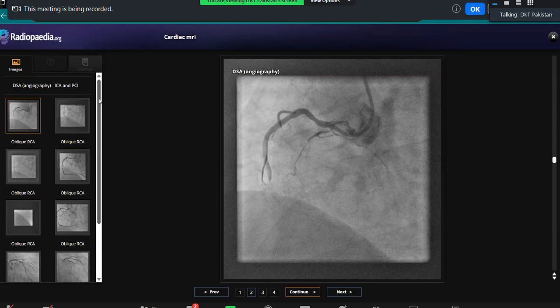Okay, and one more thing, they might give you clues in FRCR exams. When the examiner gives you a clue, it is a very valid clue. So I gave you a clue. You talked about this wall being the posterior. I said no, the standard terminology is inferior. Please stick to that. And continuously you said posterior, posterior, posterior.